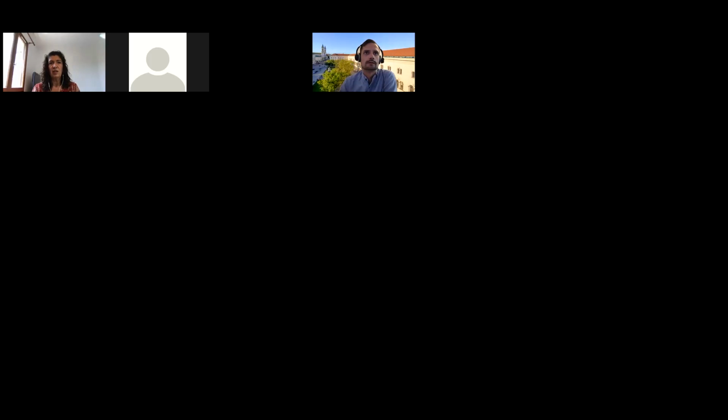All right. And we remind participants that this is a more interactive session. You can ask questions at the end of every chapter, I would say, not all the time, and interrupt the speaker. And Niklas is going to answer questions while Hans-Peter is doing the demonstration. Okay, I think you can start. Yeah, Hans-Peter. Yeah, thank you, Jutta.